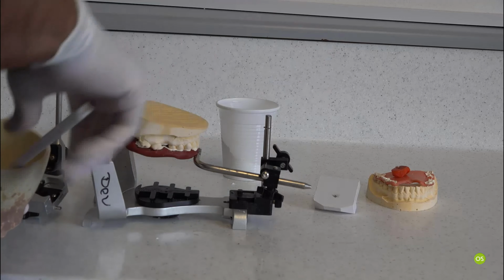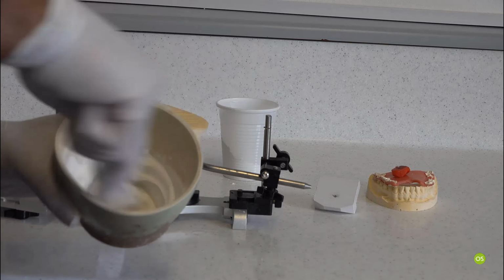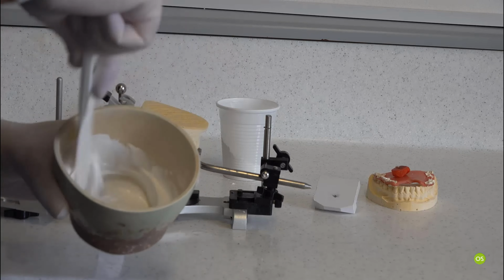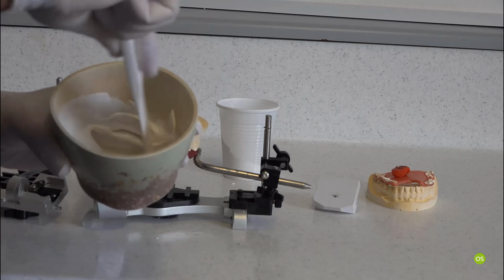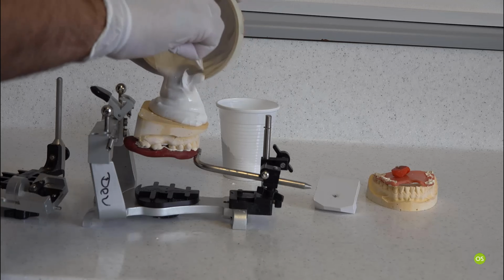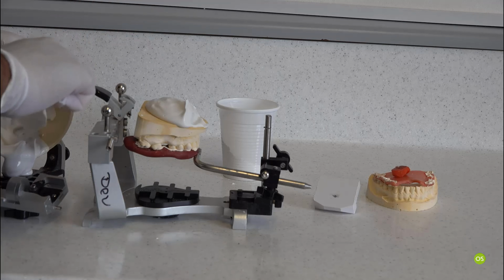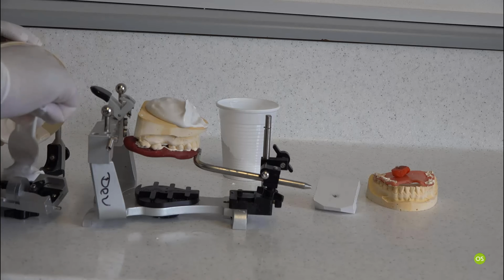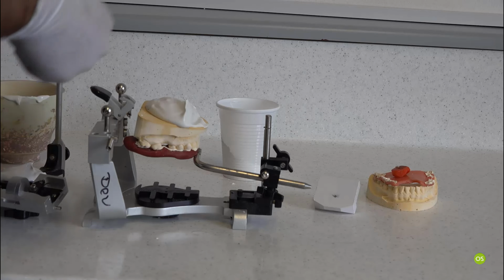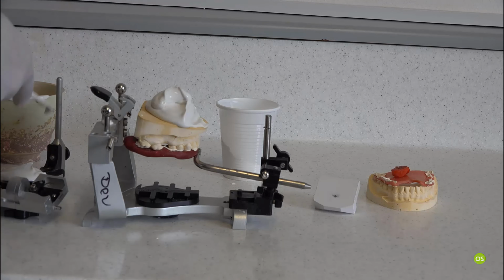When you're mixing the plaster, you need to make sure the consistency is very runny. It's not very hard. The reason being that if it's really hard, it will produce a lot of heat while setting and it will expand. All plaster expands, as we discussed, and when it expands, your mounting can get affected. So make sure of that. These take some time to set, so you have plenty of time to work. No need to panic, because you have mixed a runny mix, it takes time for it to set.